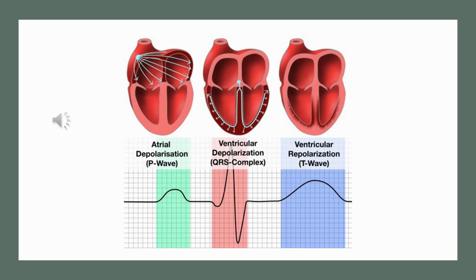Any abnormalities that we see in the T wave shape or its height can mean that we've got ischemia, some electrolyte imbalances, or we may have some different medication effects. So some key takeaways here: depolarization just means we're in our contraction or systolic phase. The way I remember this is systolic is the squeeze phase. So we're contracting, we're squeezing that blood forward. And then we also have repolarization, which is that relaxation or diastole period, which allows the heart to relax and refill.